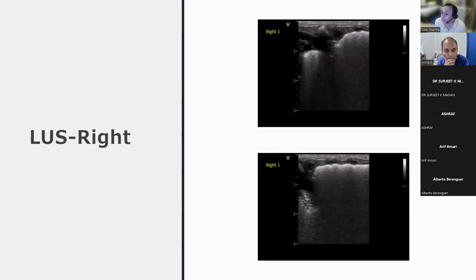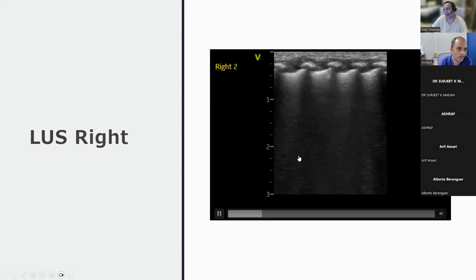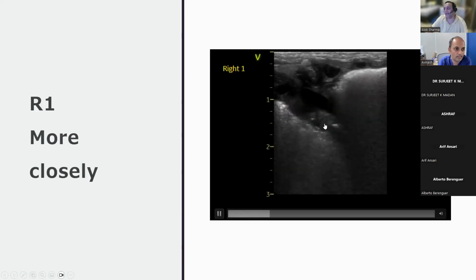Okay, but just in terms of, could this be infection? Early infection? Yes, it can be. Could this be mechanical obstruction secondary to secretions? Yes, it could be. What else could it be? So right upper lobe collapse consolidation. What other things cause a right upper lobe collapse consolidation? You need to see the tube position.